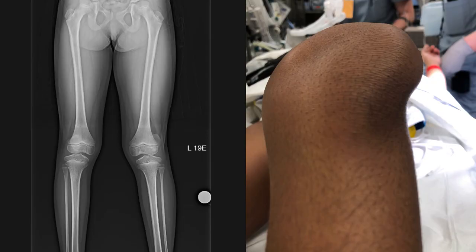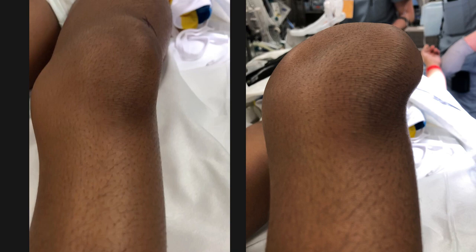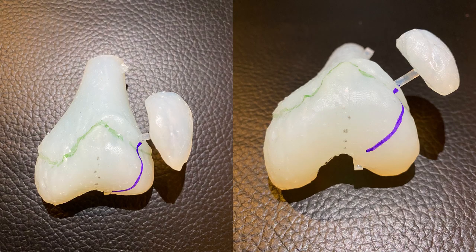While 3D printing is instrumental in the understanding of the patellofemoral joint, consider the neuromuscular patient. This 7-year-old girl has dystonia in both of her legs, meaning she has involuntary muscle contraction. Early development with this motor pattern has caused an unstable patellofemoral joint, which is causing pain and gait dysfunction. I colored the physis green here and added some gray dots at the center of the trochlea. The purple line represents the path of the patella as the knee progresses through flexion.